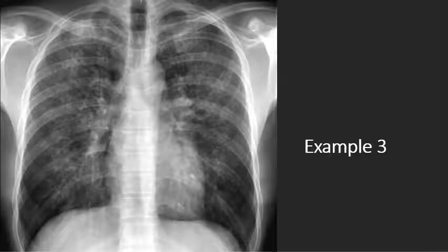So moving on, we see the trachea. Here's our trachea and our carina. There is the trachea, it's midline. I don't see any endotracheal tube in the patient. Going down to the hilum, they look a little different, not so hot. And looking at our heart, we see that the heart is less than 2/3. It doesn't look like it's rotated. It doesn't look mal-rotated.